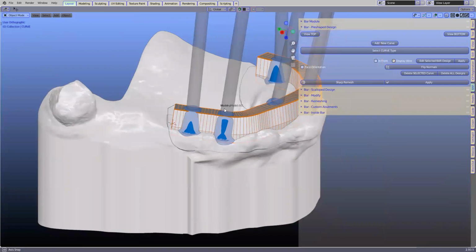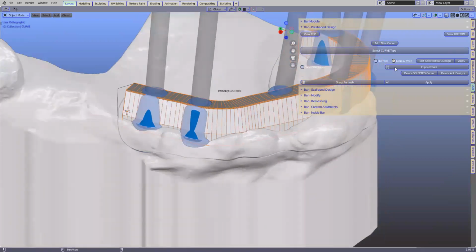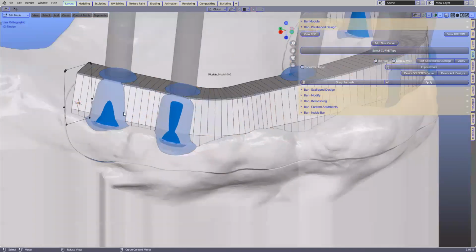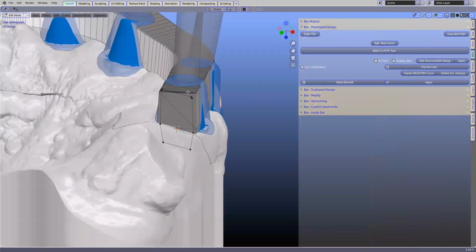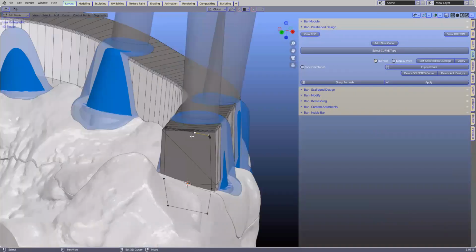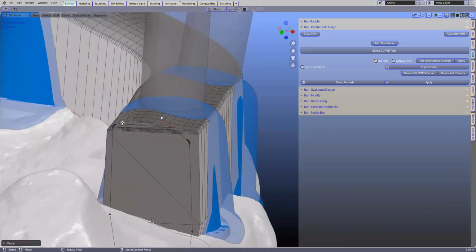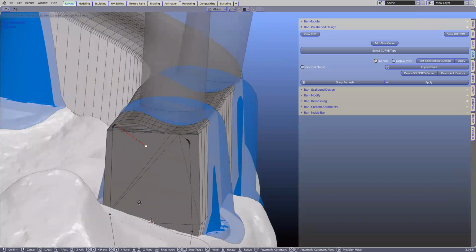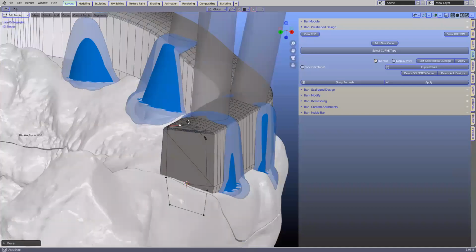Assuming now you want to change this design and add something, we can easily just go to edit selected bar design, and that'll bring out this little thing that you've pre-made. We've got quite a few that have been made, but you can design your own. So for example, now I will select this one. This is a curve, and if I stretch it up, we can shape this in whatever shape we'd like it to be, which is a very powerful tool to have.